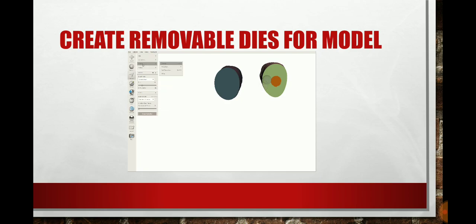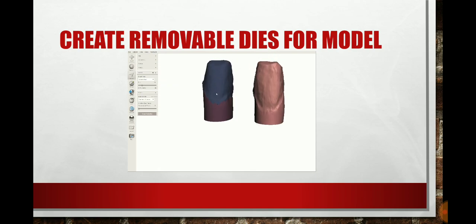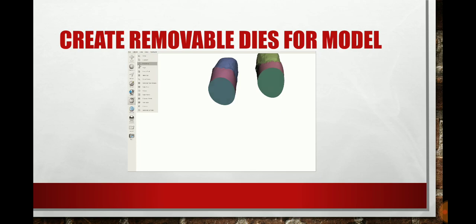And then you do the same thing for the other one. And what you're gonna do, you're gonna do this separately. So you're gonna hit transform. Once you hit transform, you'll be able to see the little movable parts, the arrows and everything like that. Okay. And then I think I have to go do it one more time in here. I think I moved it or did something different.